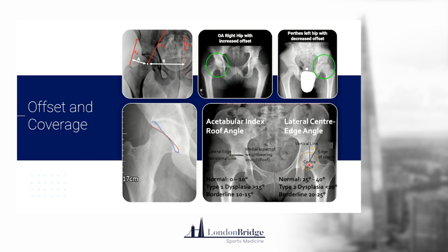There's other ways to do that using angle. The center edge angle is probably the one we use the most on an X-ray, and it's just saying what is the angle between the vertical line and the edge of the acetabulum, basically, to see how much over coverage there is. And if you've got someone with a really over coverage, so we're talking anywhere between 40, 50 degrees, you can imagine they're going to be impinging, you can imagine they're going to be suffering with lots of flexion-based issues, whereas someone who's got a dysplastic hip may be hypermobile, may have a thickened labrum from that point of view as well. So that is very, very useful when you're trying to get an idea of the biomechanical picture.